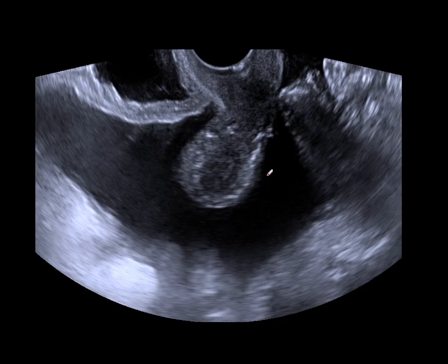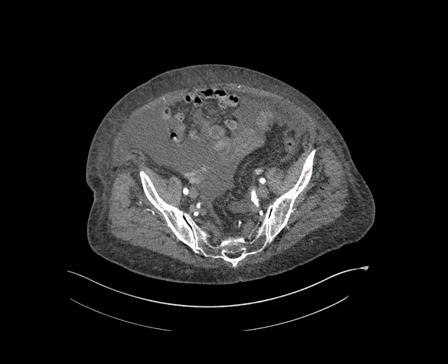And there's the patient's uterus, there's the bladder, and ascites. So the patient went on to have a CT scan, which did show lots of ascites. Not a very good quality scan, but there was no omental tumour identified. Unfortunately, they haven't given oral contrast here, which is a bit disappointing. It's always nice to give positive oral contrast in these cases.